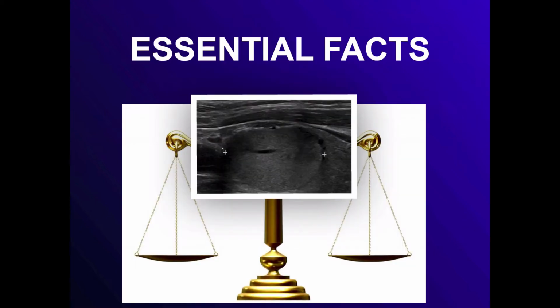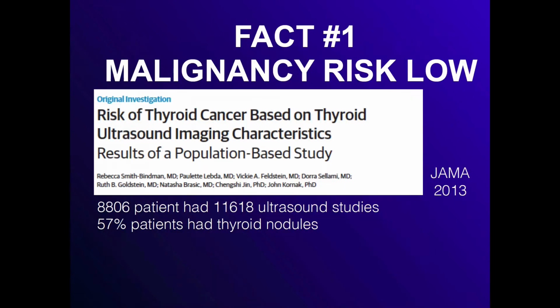Does that sound good? Okay, so if you have a thyroid nodule that's solid on ultrasound, like this one, the decision is whether you FNA it or you don't FNA it. Well, when you're making this decision, I think you need to think about it in another way, not just whether it's benign or malignant, but also to acknowledge some essential thyroid facts.